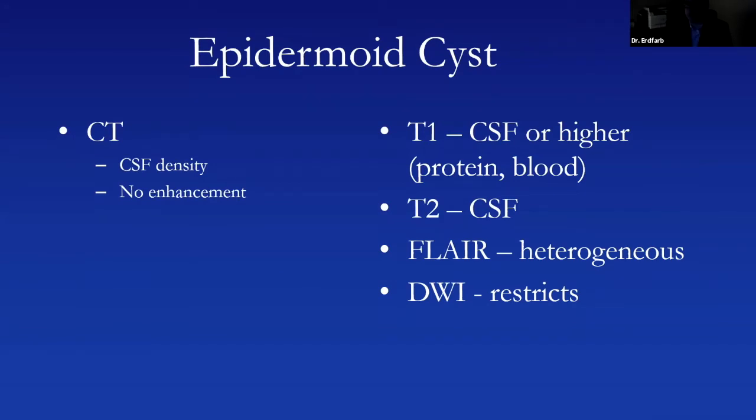And again, just going through the signal characteristics, this is what you're looking for. And again, importantly on CT, it really does oftentimes look just like an arachnoid cyst.